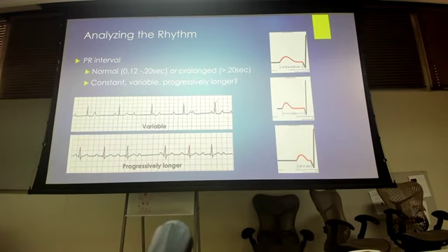Okay, what about this next one? So we have our PQRST. Okay, if we look though, look at that little tiny PR segment. It might be normal, but then when we look at the next one, why is this P further away? And why is this P even further away? And now, sir, we have a dropped QRS because our PR segment got longer and longer and longer to the point now we have a total block of depolarization.